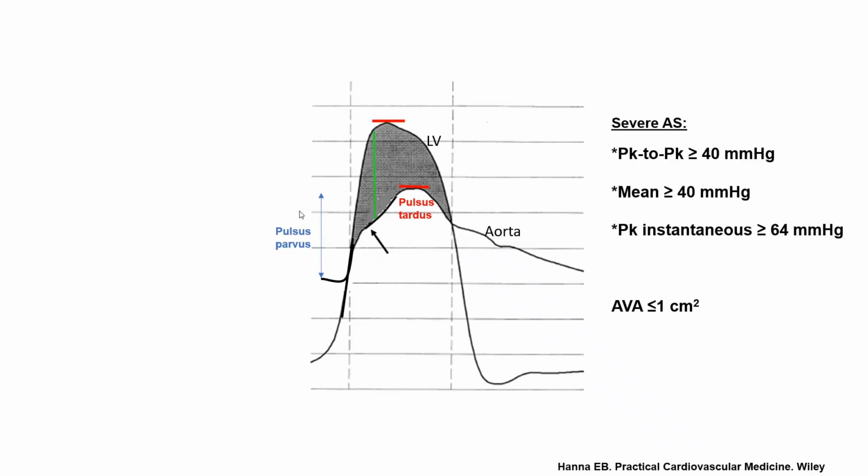So the pulsus tardus and parvus become less sensitive in the elderly, and the anacrotic notch may get attenuated. Notice also in general in aortic stenosis, not only is there an anacrotic notch, the dicrotic notch tends to be attenuated, evidently because the valve barely opens, so it barely closes as well. There isn't a lot of movement upon its closure.